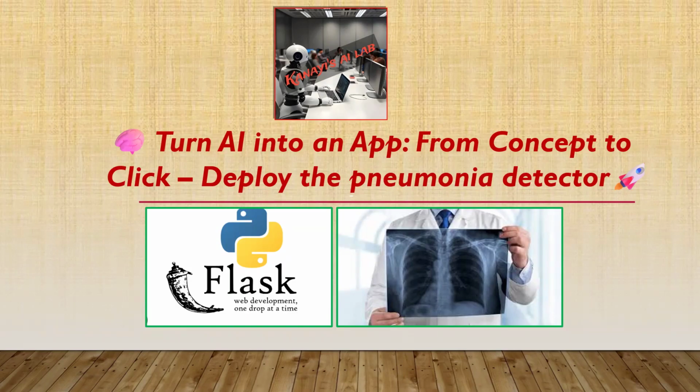As we all know, AI is becoming a game changer in healthcare, from early disease detection to faster diagnosis. It's basically helping us to make smart decisions. So we will be exploring one such case in this particular video, where AI looks at chest x-rays to detect the signs of pneumonia, a condition that affects millions of people globally and becomes life-threatening if not identified early.